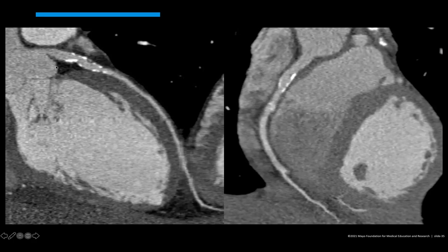Yeah, so most of the time the coronary arteries will come off of the apex of the sinus. Sometimes they'll come off a little bit high. This one seemed kind of high, very close to the sinotubular junction. Sometimes they can arise above the sinotubular junction, and those are usually insignificant. But yeah, I think you correctly identified one of the main findings, that there is calcification here in the vessel wall. And this is the left anterior descending artery on the left.